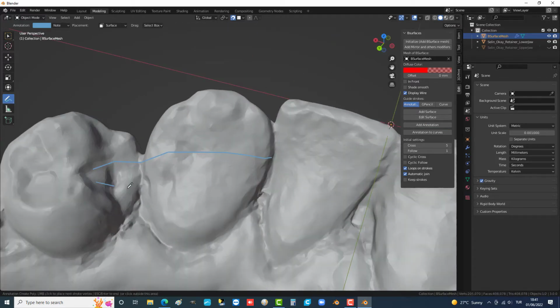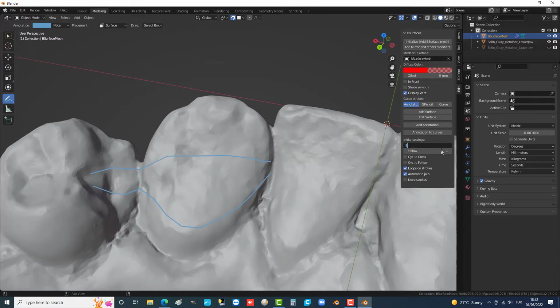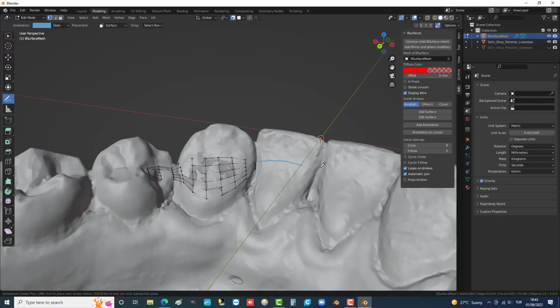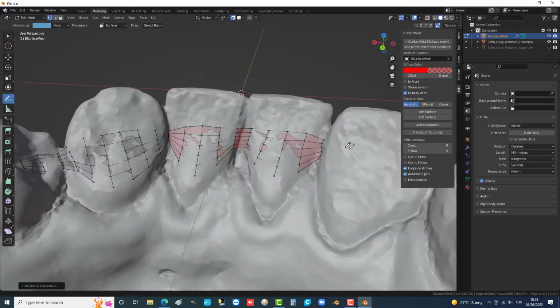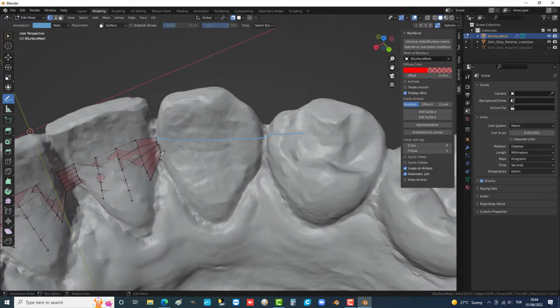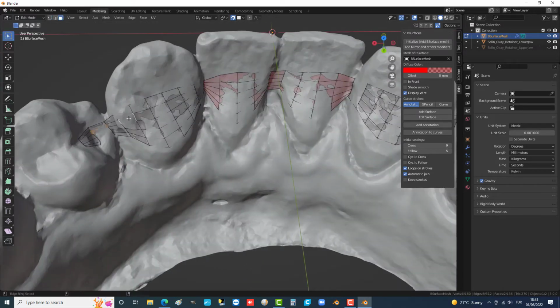There are a lot of advantages to using some kind of a retainer. Easy to bond, easy to clean the residue, and most importantly, we can avoid composite flow around the soft tissue. Then the patient can easily clean the teeth and keep the teeth and the soft tissue healthy. The adaptation is perfect and we won't give any movement with the retainer.